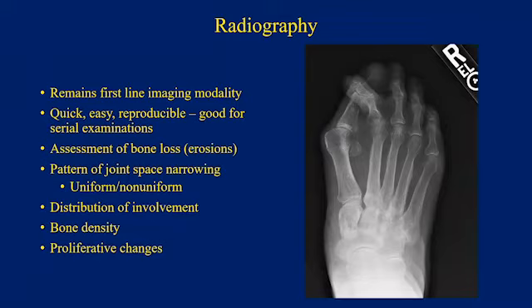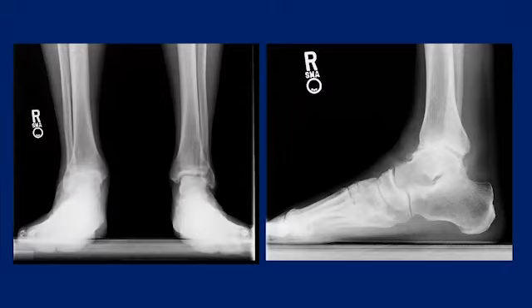These are AP views of both ankles. We're looking at the symptomatic right, and the left side is for comparison. We also have the lateral view of the right on the right-hand side of the screen. We can see in the right ankle there is non-uniform ankle joint space narrowing, preferentially anterolaterally. We still have a little bit of residual lucent joint space posteriorly, subchondral sclerosis, and anterior osteophyte formation to define the presence of osteoarthritis.